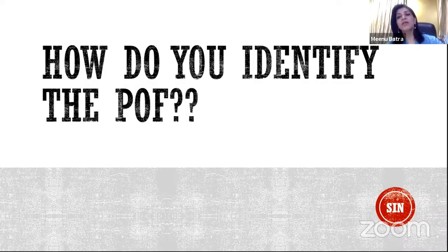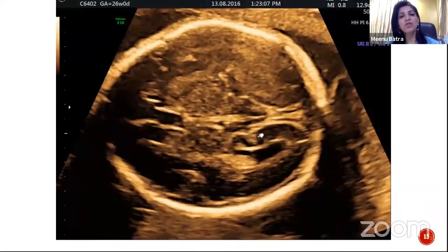Yeah, thank you, sir. So Seneesh, Mohit sir has been actually stressing on the fact that identifying the parieto-occipital fissure is really, really important because that is one of the major landmarks. So can you once again reiterate as to how do you identify this parieto-occipital fissure on ultrasound?